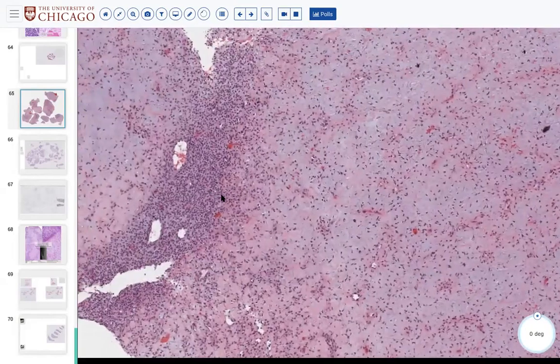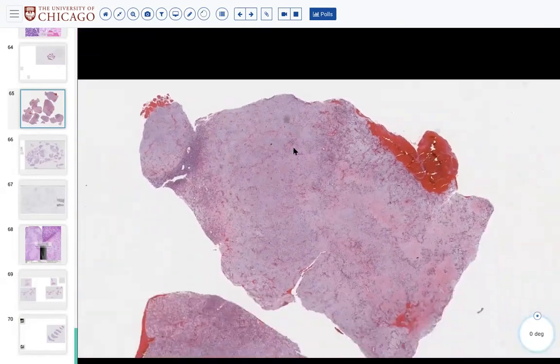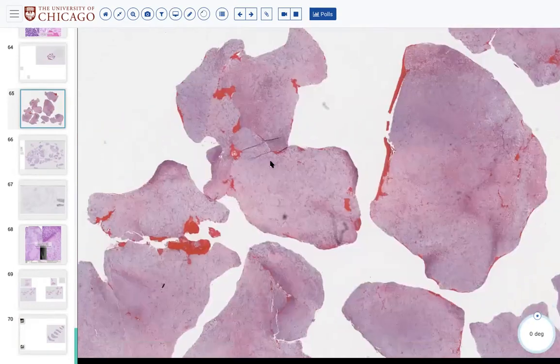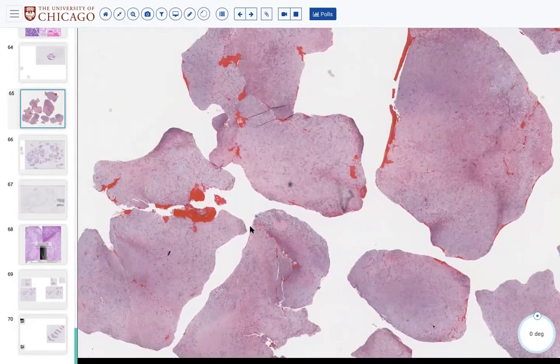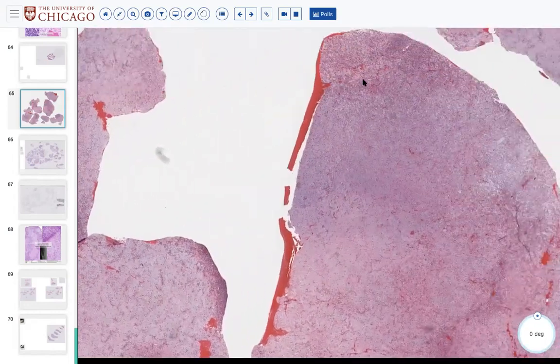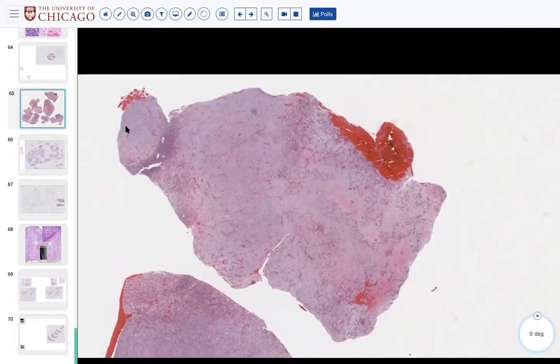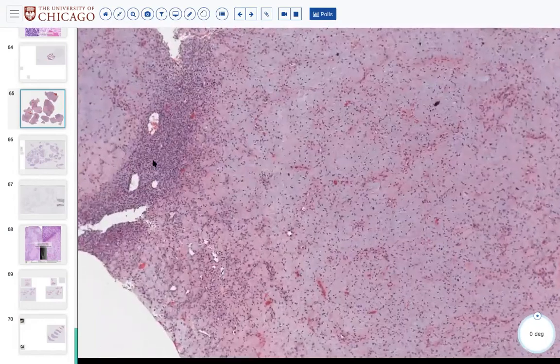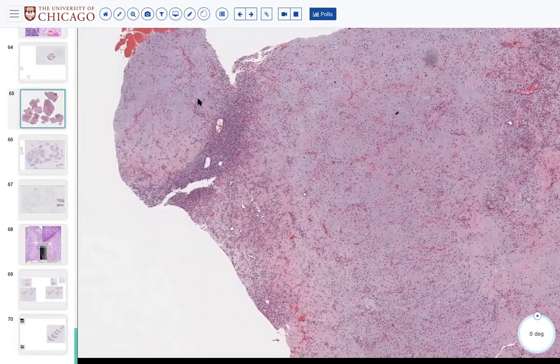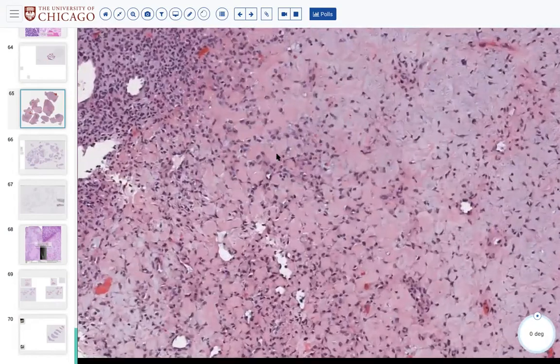Is it lobular? I think when it is biopsied in chunks like this, the lobular architecture is hard to appreciate. We can't really tell the peripheral cellularity, and when I say peripheral, we have it literally at the periphery of the tissue, right? Exactly. But here it's at the periphery of each of these lobules, kind of as a crescentic shape between. We have to imagine what it would have been inside too. Imagination is always very helpful in pathology.